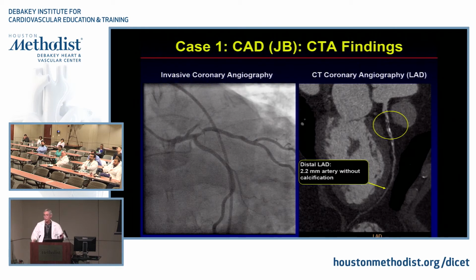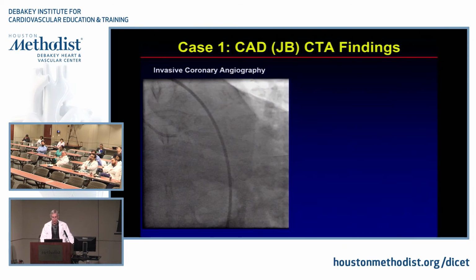We see the margins of the artery beautifully. Even if there isn't a heck of a lot of contrast in there, we're still going to be able to see the artery very, very nicely. Look at what we see just on calcium scores, right? Without any contrast, we can still see all the distal arteries. Why? Because they're surrounded by fat, right? So we're able to see that very nicely.